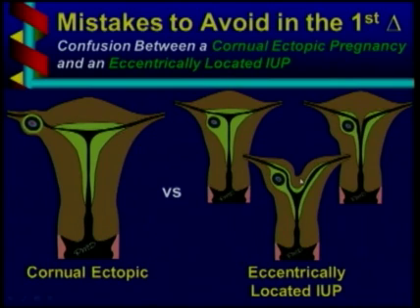Another situation that you can have an ultrasound that's eccentrically placed relative to the left to right side of the uterus is if you have a bicornuate uterus, as shown here, or a septate uterus. In all these three cases, the pregnancy or gestational sac is eccentrically located, but it's not a cornual ectopic pregnancy. This one is an emergency. This can lead to severe or even life-threatening bleeding to the mother if the cornu ruptures. These need no treatment and may well go on to a normal baby.